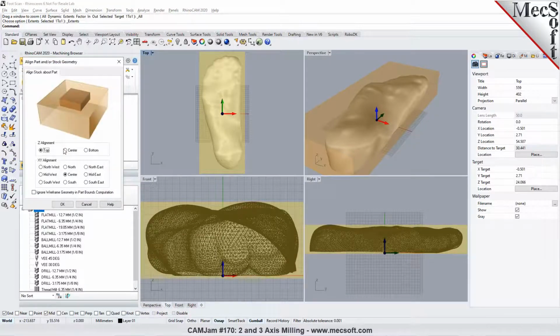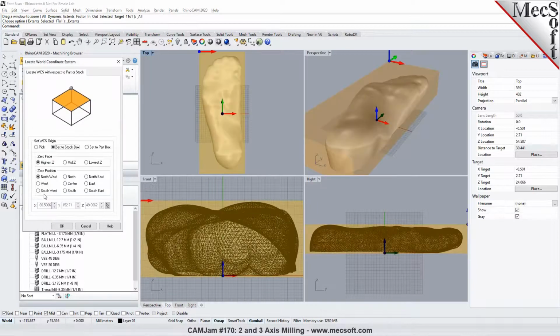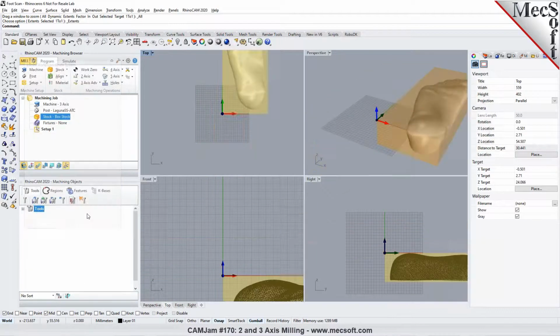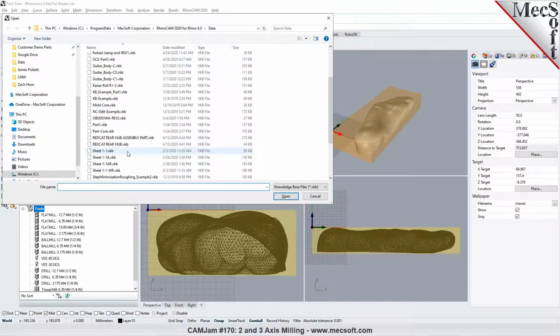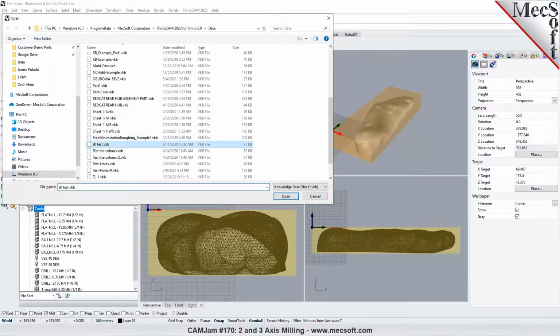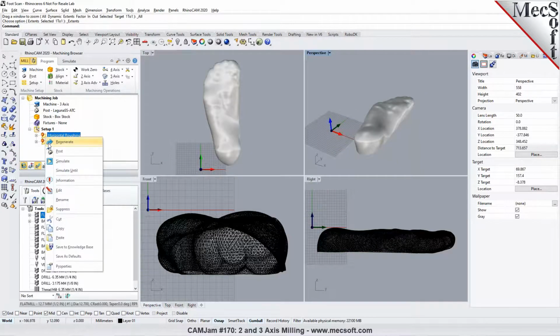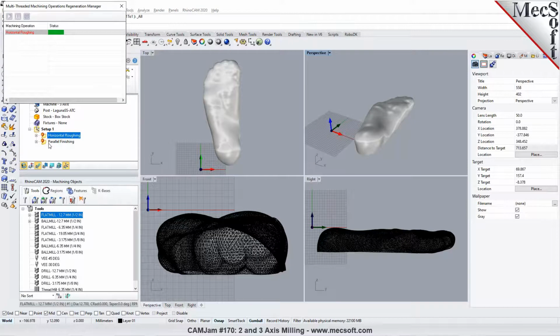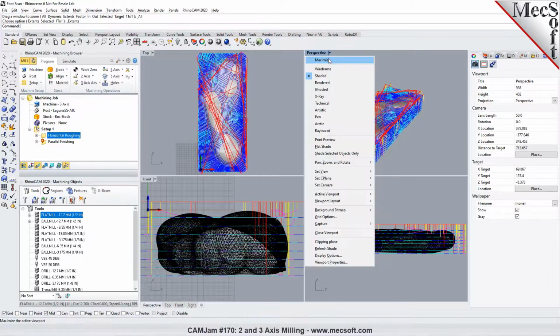So very similar to what we did on the previous step, right? Yeah, right. So we established a 0, 0 right there. Now, rather than creating the toolpaths right from scratch, like we talked about using knowledge bases, I can use a knowledge base from the previous part we worked on here, which is the STL test. So we have this knowledge base right here. And now if I just generate the toolpath, it's going to compute the toolpath based off the part and the stock automatically.